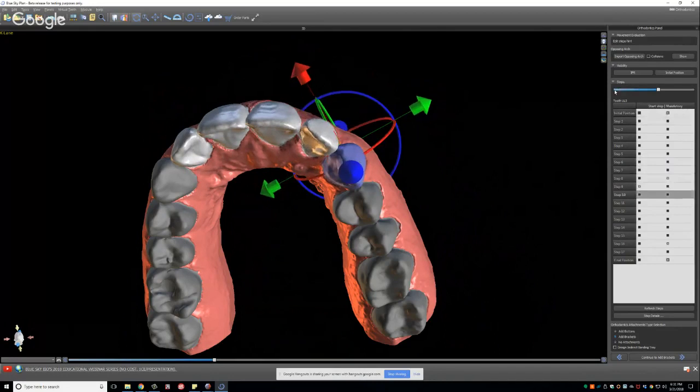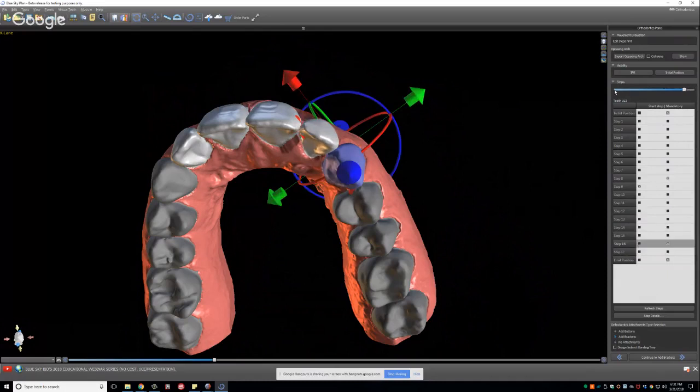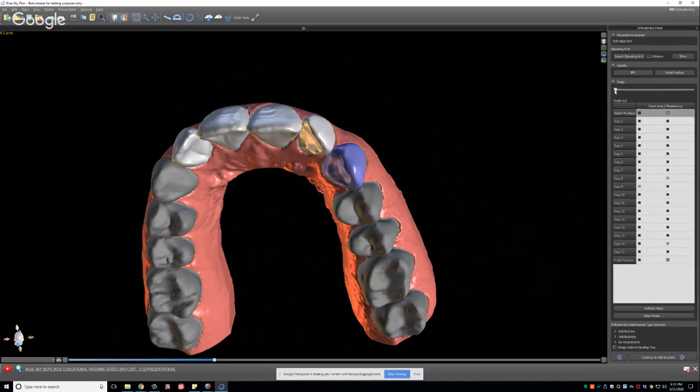And what will happen is it won't move until then, and it finishes moving at the very end. So just keep that in mind. If things get in the way, that will help you. Now, this case really doesn't need much of that alteration. I wanted to show it as a demonstration, but it is not really necessary in this case.